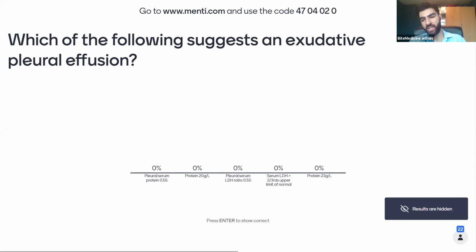What's a PICC line? A PICC line goes in through the arm, in one of the arm veins. A central line goes in through one of the neck veins. Would effusions look different if a patient was supine? Potentially it might be a bit more difficult to see if it's small, but if it's large, you'll still see that meniscus and the loss of the hemidiaphragm, etc.